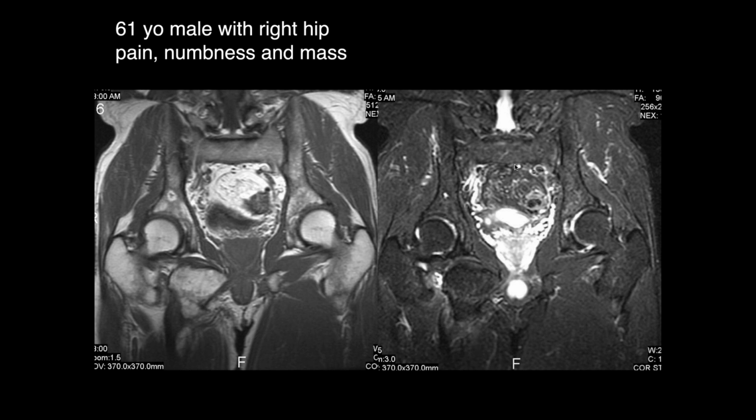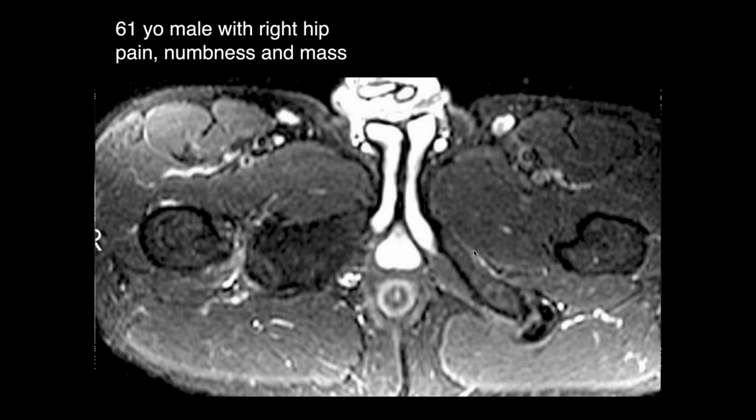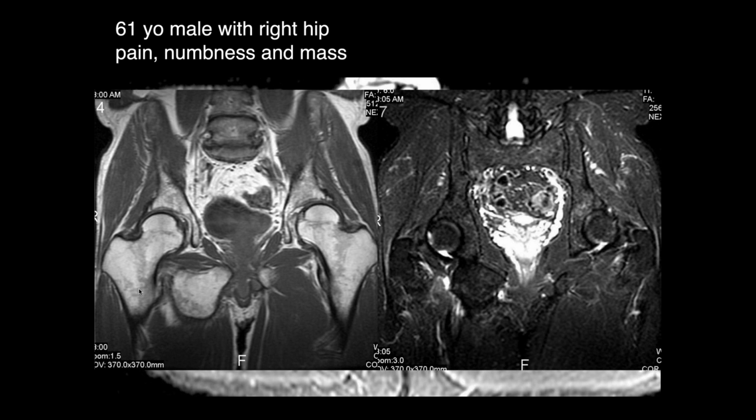Okay, this is a male. It looks like that's bone where the ischium is. I don't know if it's attached, like if that's part of the ischium, but I'd want to see some other cuts. So there's hypertrophy and kind of abnormality of that right ischium. It's not edematous compared to the left. So I would assume they probably had prior trauma and fracture with bulky heterotopic ossification and now marked ischiofemoral impingement. There's probably like 5 millimeters right there.